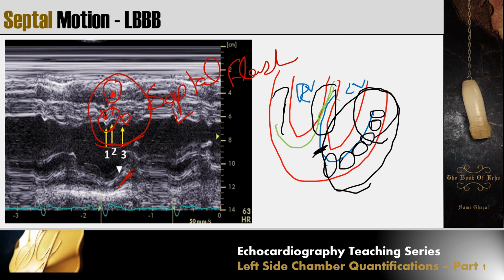The most important thing here, in order to say that there is ischemia or an abnormal wall, you have to look at thickening of the walls. Is it thickened? See the thickness here, thickness here. So it is thickening. So you don't have any ischemic problem in this wall. It's only a conduction abnormality due to an electrical problem.